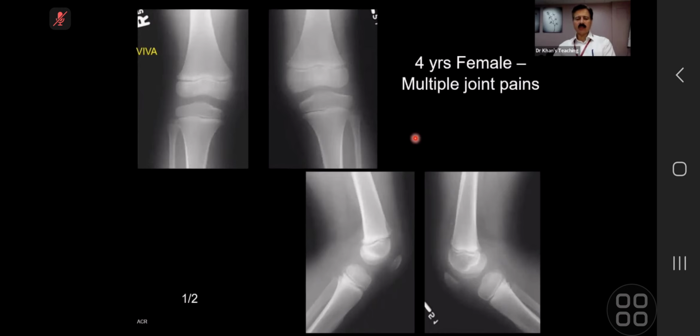And then there can be premature closure of the epiphysis also. The same case, they might show it to you at the age of 20, 21, when the epiphysis has closed. And that I will show you shortly. So that also becomes a very important exam film.